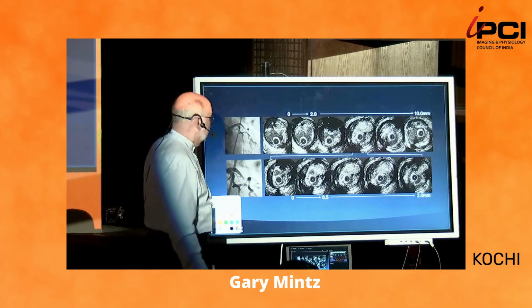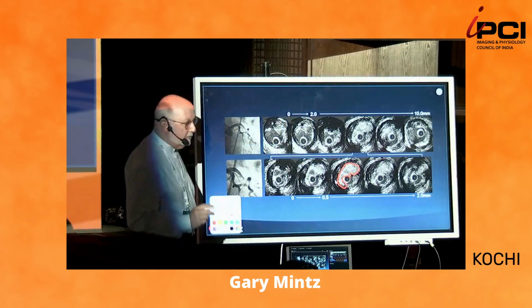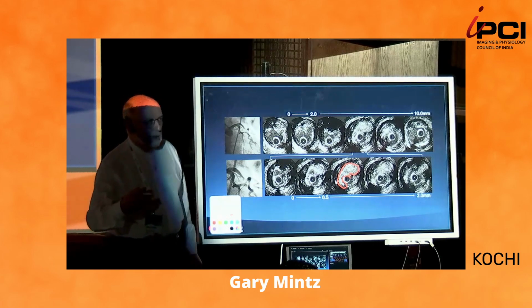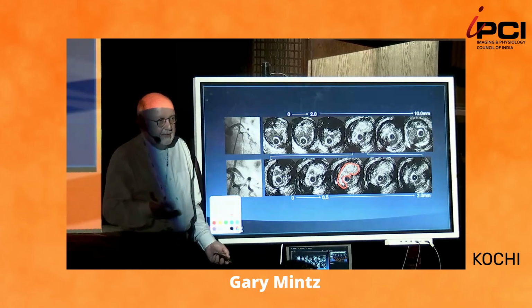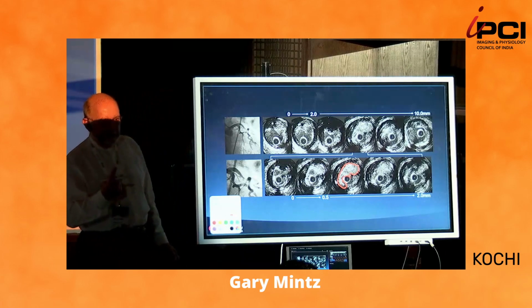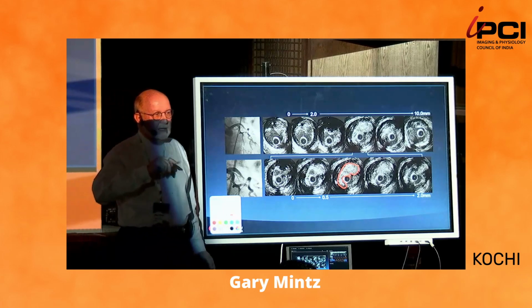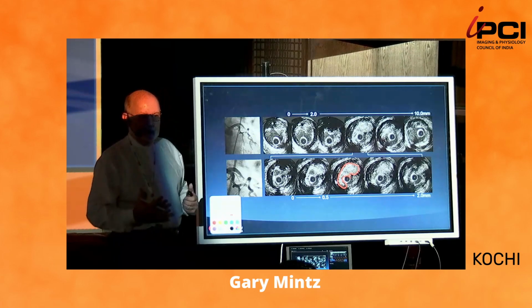This is another example of a plaque rupture, but in this case, the rupture site is filled with thrombus and is protruding out into the lumen to compromise. So plaque ruptures by themselves contribute to disease progression, but they're not necessarily bad unless they compromise the lumen. And they compromise the lumen based on two things. One, they become thrombotic. And two, you've had enough recurrence of plaque rupture at that site to have a large plaque burden so that the next plaque rupture compromises the lumen.